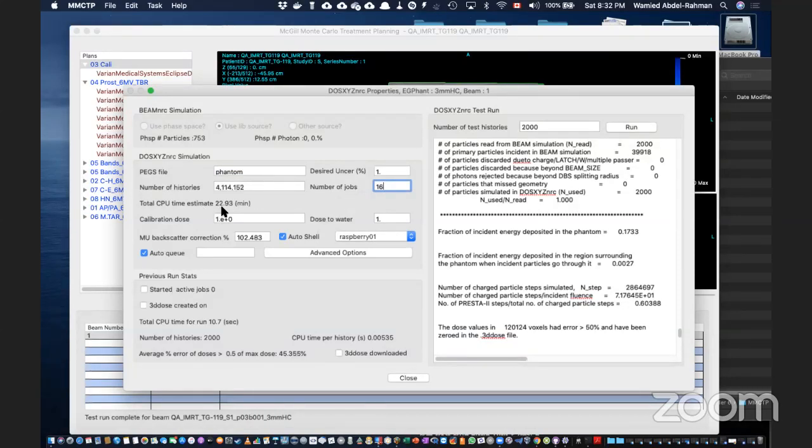Then this is going to take about 20 to 25 minutes. Just so that I make things quick, this is 33 seconds. Let's do 5 minutes. So this will take about 5 to 6 minutes.